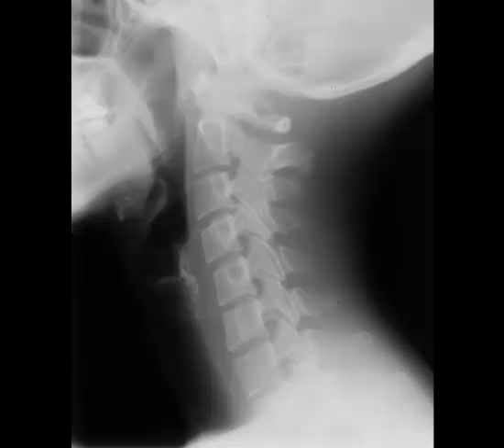Now, the lateral cervical neutral projection is useful to see the spine in the sagittal plane. We can see the vertebral segments very well, as well as the posterior arch and all their associated anatomy, which we will cover today. I wanted to continue with C1 segment and demonstrate the anterior and posterior arch for you so that you can see it in a different perspective.